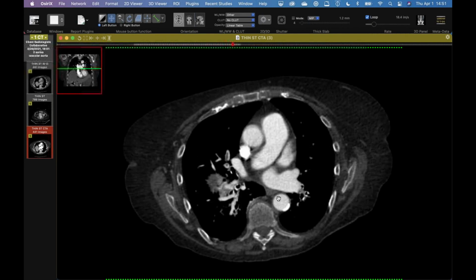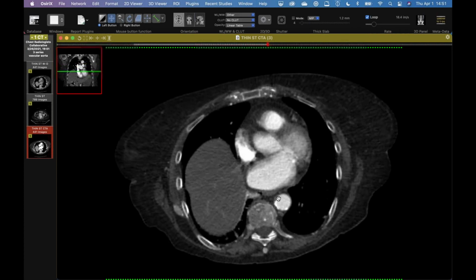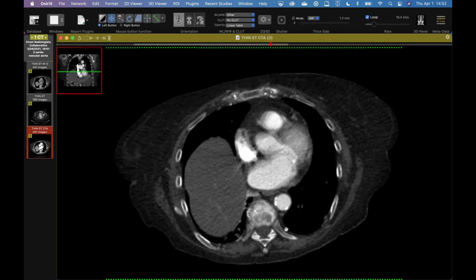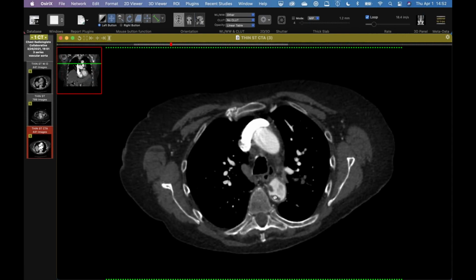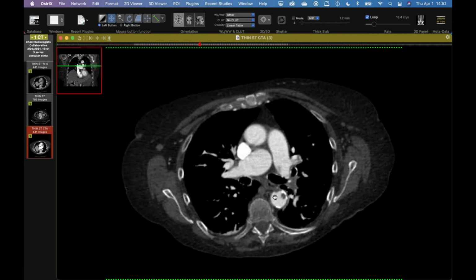So there's venous clot, systemic venous clot, pulmonary arterial clot, systemic arterial clot. The question is, is there a PFO? Is it a paradoxical embolus? It does not appear to be. And this almost looks like in situ thrombus rather than embolic thrombus because there's multiple ones, unless it fragmented at some point. But I guess that's a possibility.